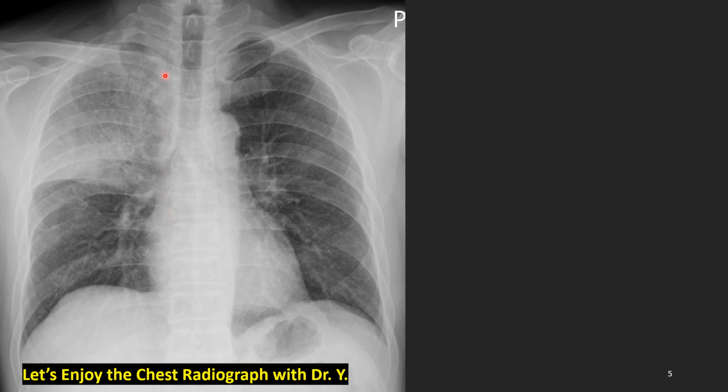What do we see? In the upper lung zone, we see haziness or consolidation with bronchus. That means air bronchogram. Air in the bronchus surrounded with something filled alveoli, and the lower border is the minor fissure. Yes, this is upper lobar consolidation suggesting pneumonia. Minor fissure is here and major fissure is here about. So this is definitely right upper lobe pneumonia.